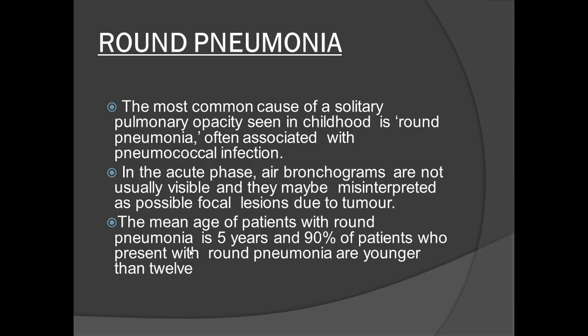So when they develop, they allow air drift between parenchymal subsegments. So infection dissemination occurs throughout a lobe, leading to a lobar pneumonia. Usually due to lack of these channels, the infection is confined and it is depicted like a mass. It doesn't show, sometimes, the air bronchogram. Usually it happens up to the age of 8 years.